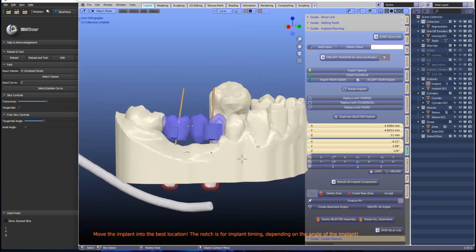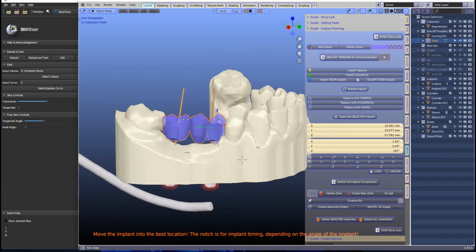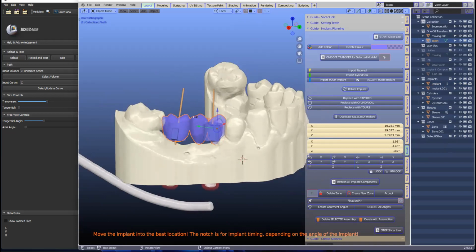Absolutely. All right, so Michael, just one question. If you wanted to revert back to, say, choosing just 2 molars because the situation is a little bit compact, would you just delete them all and go back, or would you just bring in from the wax module? Could you do 2 scenarios at this point or not?